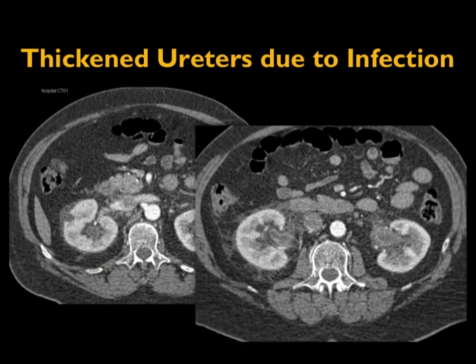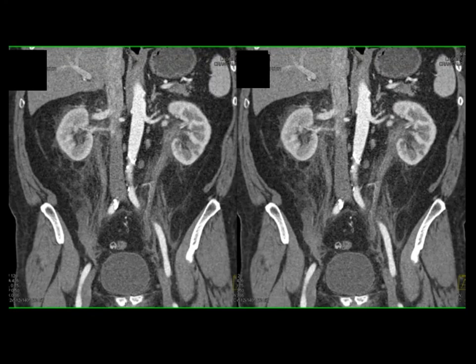And here's just a nice example showing you where the stranding around the kidneys is seen bilaterally. The patient has good visualization of thickening of the renal pelvis and enhancement of the renal pelvis bilaterally. You look down at the ureters, and the ureters also look thickened. So in this case, I'm very much concerned about tumor, but bilateral tumors are rare. You've got to be thinking in this case, could this be something else? An infection comes to mind, and this was due to infection. So it's really not always going to be easy to make that diagnosis.